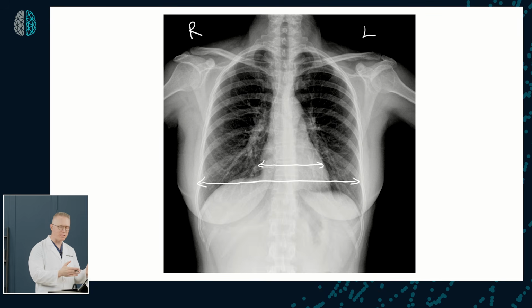So if you do see, however, cardiomegaly or the cardiothoracic ratio exceeds 0.5 or makes up more than 50% of this, right, then you would consider doing a PA to reevaluate the heart silhouette or some other imaging modality like an echocardiogram, okay?